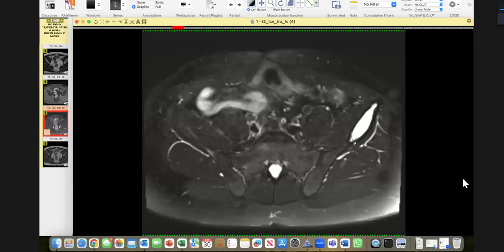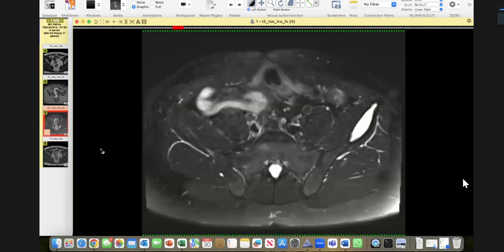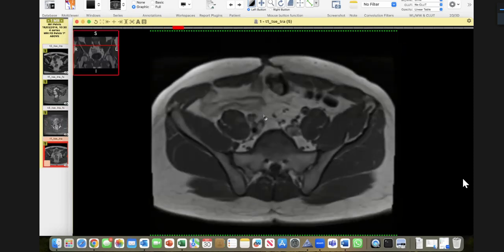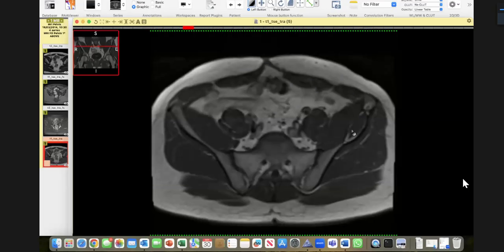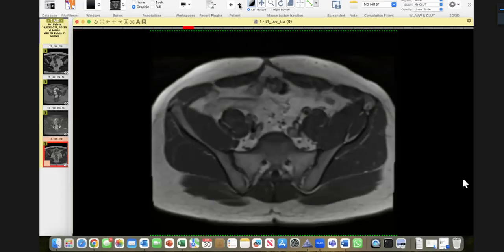Of course, MR has got a role, but here you can see a cystic lesion, if your baseline knowledge is that fibrous dysplasia can also be cystic. Here, if you see carefully, look at the signal of the margin on a T1 weighted sequence, and the margin is sort of more intense. So it is a benign lesion, very well defined.